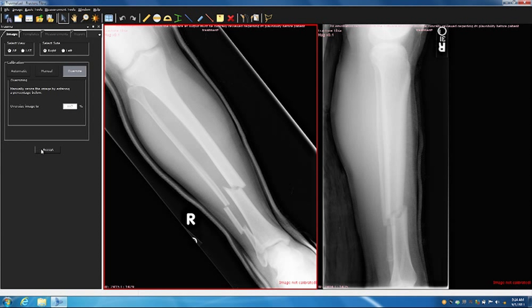The reason it's 110, 112 is because that tibia is sitting closer to the beam from the image source than the plate is, so it relatively magnifies it a little bit. 112, 108, somewhere around in there is what all total joint templates, if you look at just the pieces of plastic, the overhead projector looking things, they all have an oversize on them, and they're usually around 110, 112.